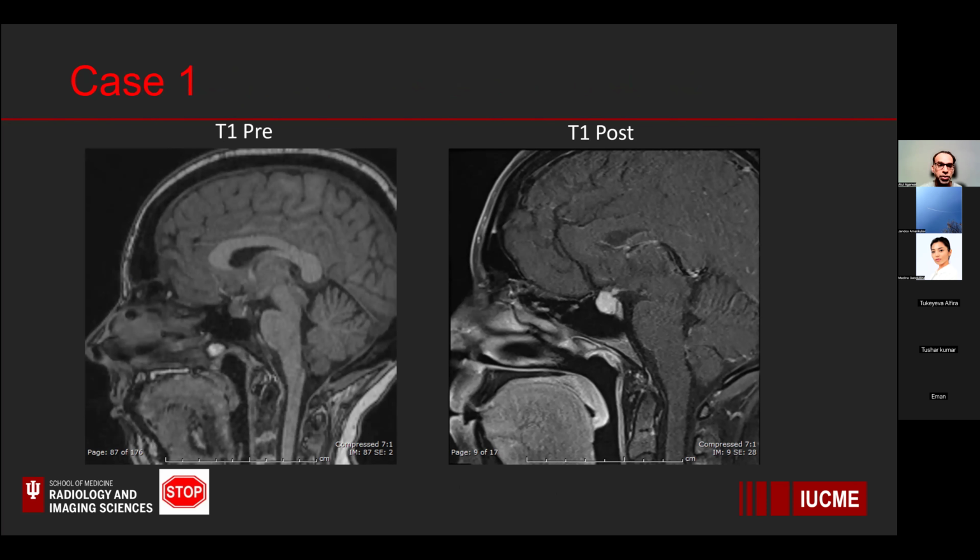This is the first case I'm going to show. And if anybody wants to unmute, turn on their video, and just take the case and describe quickly the findings that they see on the slide. And I promise you I'll help you along. Okay, maybe the crowd will warm up as we continue the lecture, but let me show you what I'm trying to show on this case.